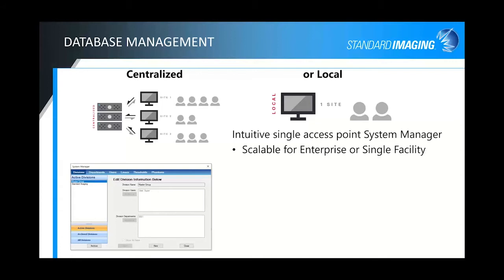Then departments, individual departments. So your St. Mary's, your specific cancer center as a department. The different users you can set up as well, and those can be set up with different security levels too, depending on how much information you want to be able to adjust or change within the system, or if you just want to have users who can input test results, things like that. So there's some different security levels that way.